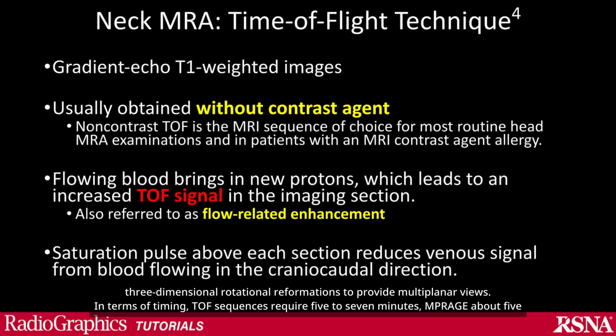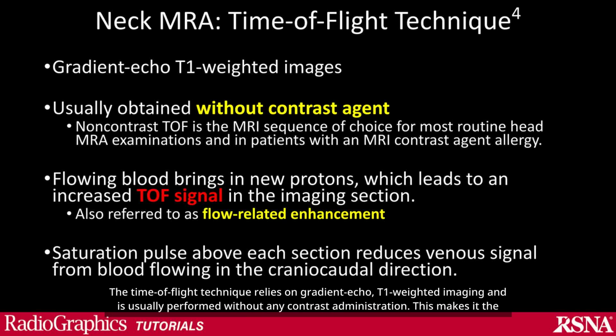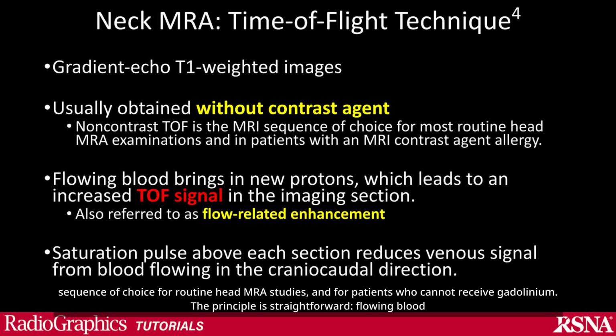In terms of timing, TOF sequences require 5 to 7 minutes, MPRAGE about 5 minutes, contrast-enhanced MRA just 2 to 5 minutes, and the post-processing of 3D reconstructions is typically performed by the technologist after the scan. The time-of-flight technique relies on gradient echo, T1 weighted imaging, and is usually performed without any contrast administration. This makes it the sequence of choice for routine head MRA studies and for patients who cannot receive gadolinium.